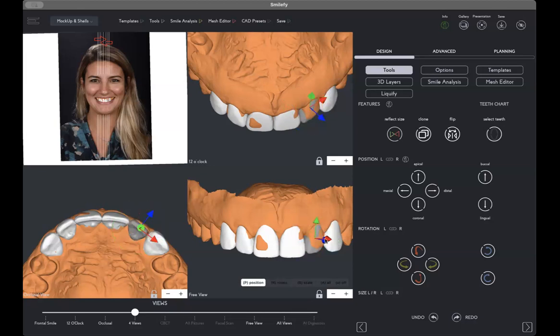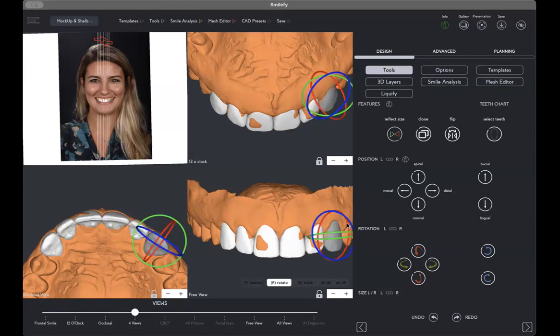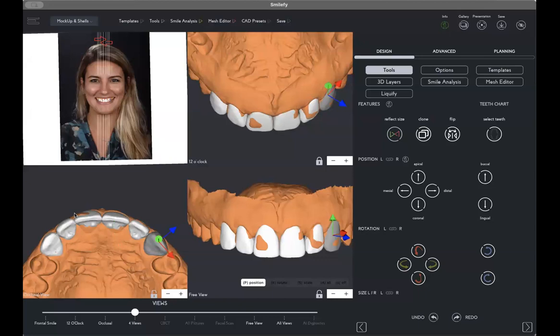For example, this lateral is not following the occlusal curve or the smile curve, so we need to make it more like this, right? When we have an ideal design and follow a certain occlusal curve that we reconstruct, we see that the position of the lateral needs to be corrected, and also the central. If it's prepped, then it needs to be reduced, and then we get the new smile.